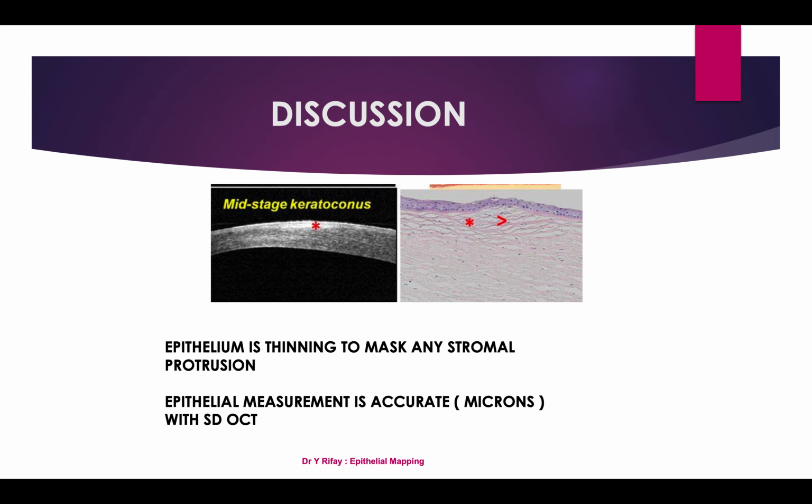So even when the thinning of the epithelium is very low, it is detected by the OCT, and it was shown in our four previous cases.